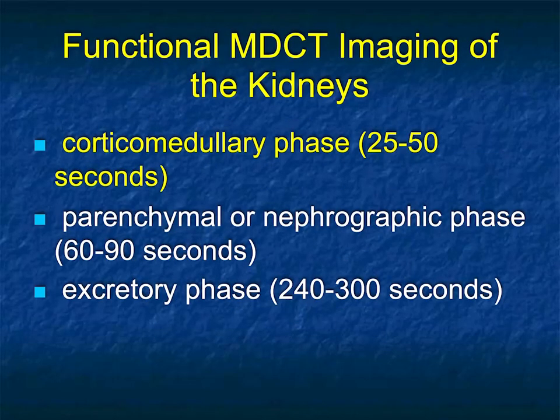Now, we've spoken about the timing of data acquisition, and we speak about this more probably when we look at renal masses and determine when a renal cell carcinoma is easier to see. We talk about the vascularity in the early phase or corticomedullary phase. We talk about the nephrographic phase, and then we also talk about the excretory phase. We also will get non-contrast scans often when we're doing tumors, but I would have to admit in the routine ER scenario, unless you're thinking about stone disease, you're typically not getting a scan without contrast.